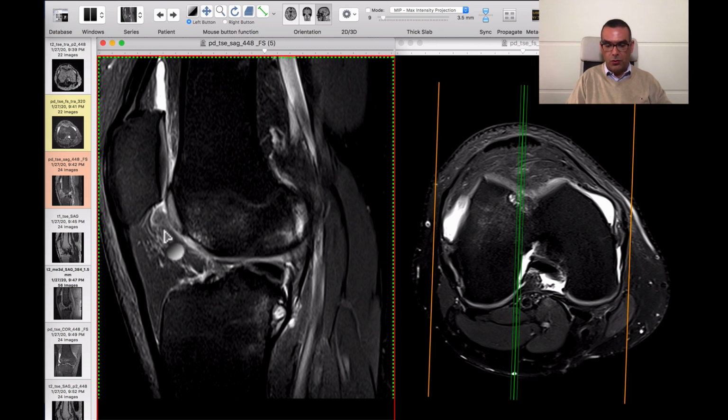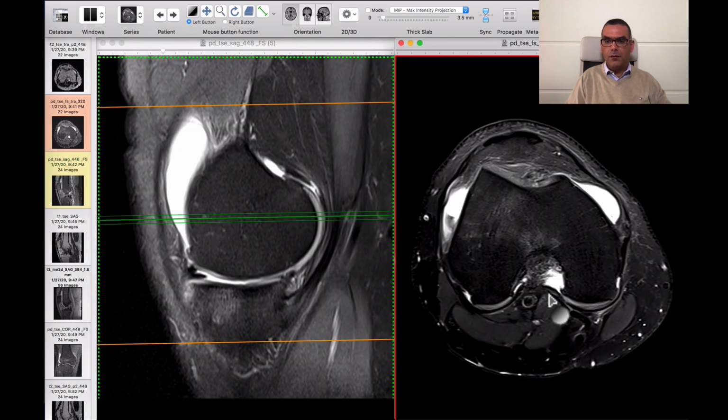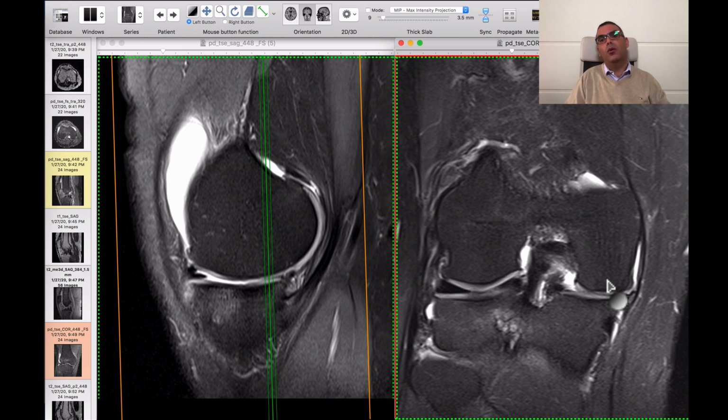This is an osteochondral defect at the anterior margin of the lateral femoral condyle, and at the medial side you can also see there is diffuse attenuation of the articular cartilage at the medial femoral condyle and medial tibial plateau. And if you correlate this with the history of previous operation, this would be secondary osteoarthritic changes that happen due to the abnormal weight bearing on the medial compartment of the knee, the excised part of the meniscus, and the other part now, of course, has a complex tear, and this apparently is a long-standing process.